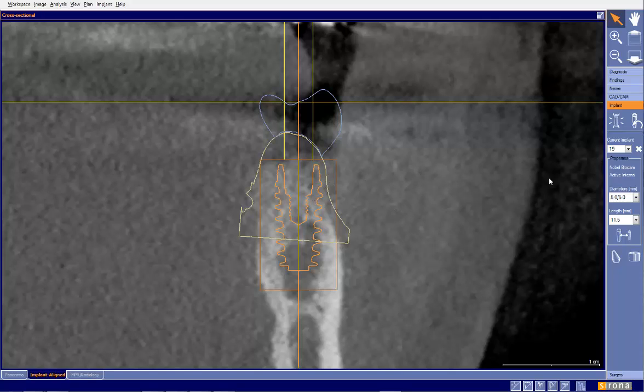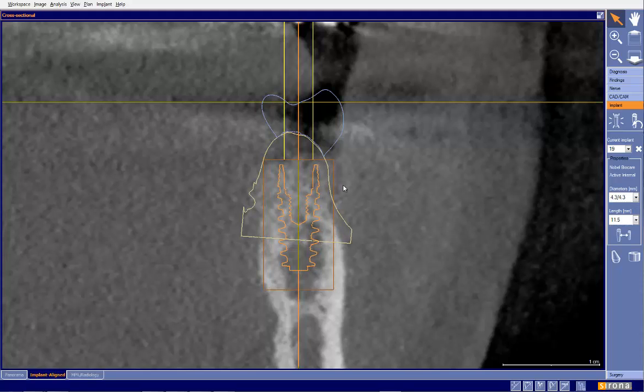So what are our choices? One choice is we can go with a thinner implant, a narrow diameter implant, but I'm certainly not advocating or comfortable with a 3.5 in the site of a molar. A 4.3 certainly is acceptable in the molar site, and here we can see that it still leaves us pretty thin right here on the buccal. So my guess in this particular case is that this case will need a little bit of augmentation.